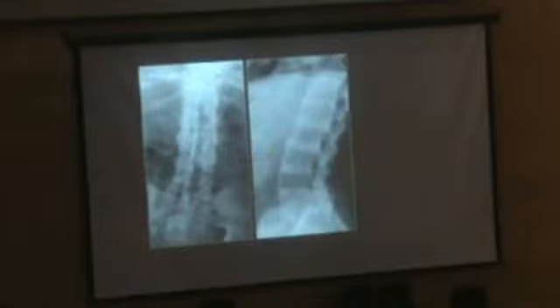So sometimes, without any important trauma, these subjects start to develop pain, another pain, unusual pain. And we do X-ray, we do any other imaging method. And you can see here extensive ankylosis with syndesmophytes. So it's a classic bamboo spine, the typical classic bamboo spine.